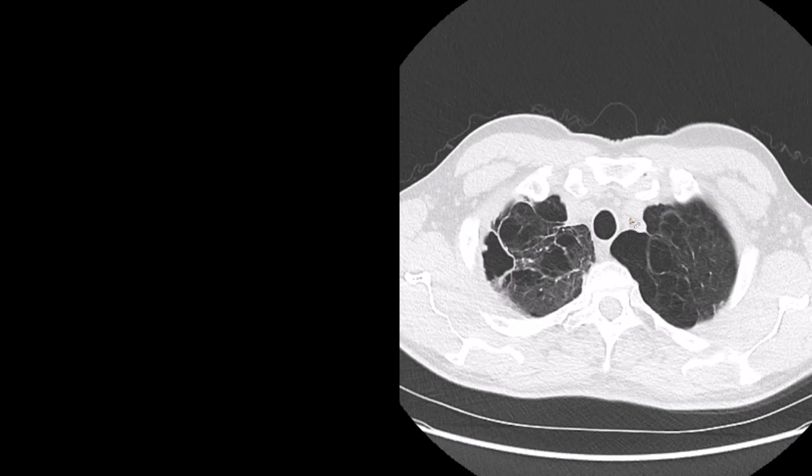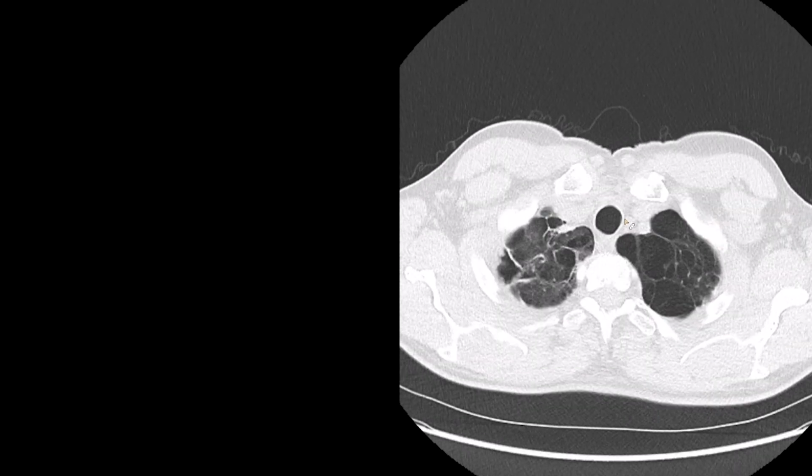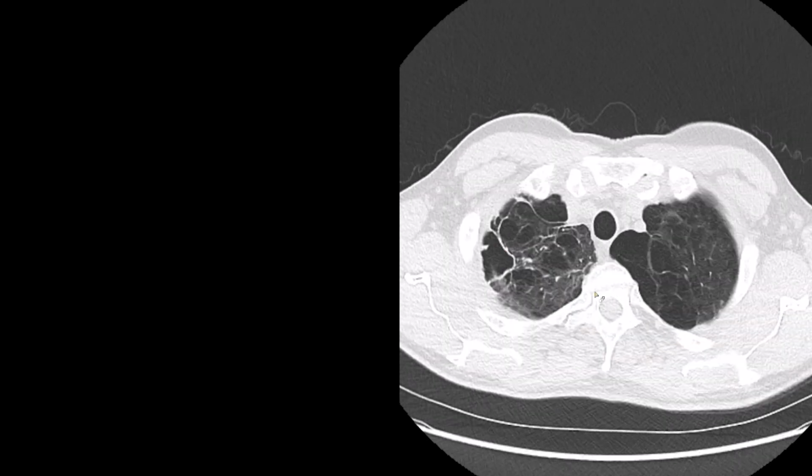It's usually very long, lasting more than a year, and a lot of patients can't tolerate the side effects, so treating these patients is a big deal. But this patient was treated, and you can see that the soft tissue component of this cavity is significantly improved. It's not fully resolved, but you can see there's significant improvement here.